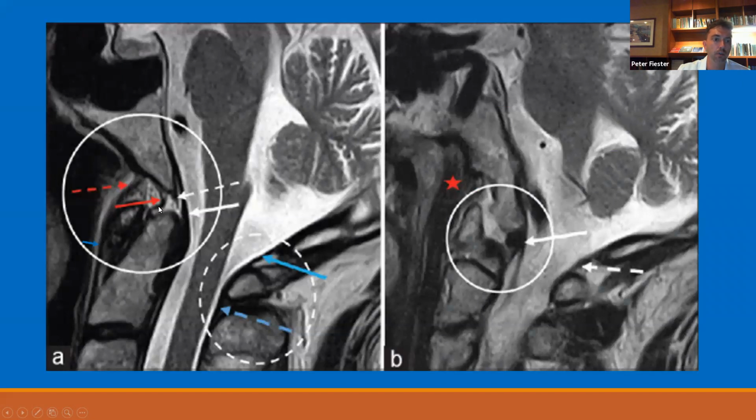This is that little notochordal apical ligament. You actually get a nice little shot of the superior band of the cruciform ligament. You have your tectorial membrane, the subclival component here, which you can see really nicely. And then the posterior atlanto-occipital and posterior atlanto-axial membrane. And then, you know, I love looking at the alar ligament on a sagittal. You can see the ligament coming up and inserting on the condyle really nicely on both sides.